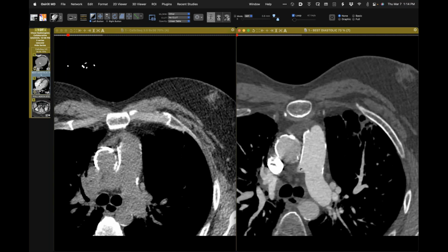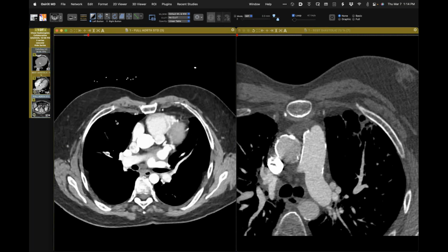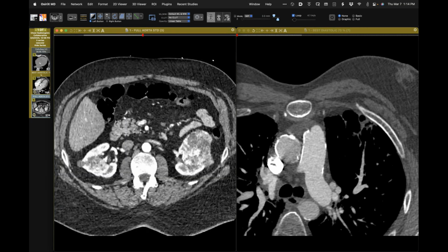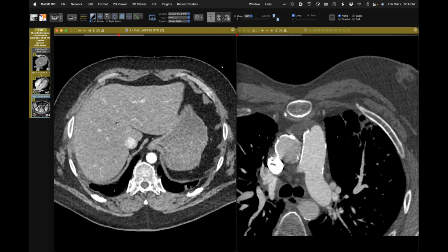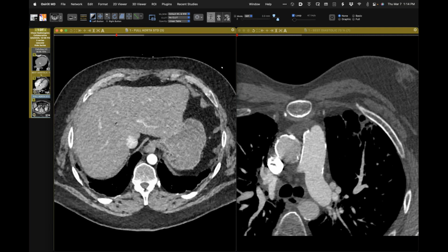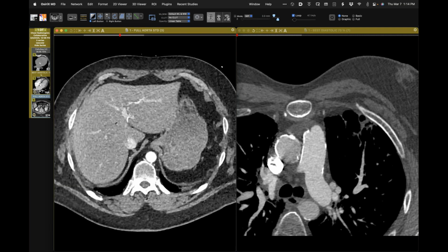Does the patient have a spleen? Pardon? Spleen? So, back in the day, they used to do splenectomy as part of staging, but that was a while back. Oh, I didn't know that. There you are. Very good. So that was part of staging in the day, right? Is that a renal cell cancer? Look there.